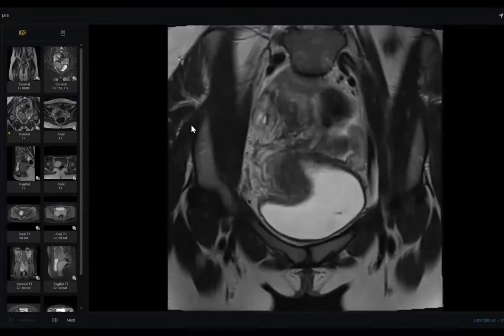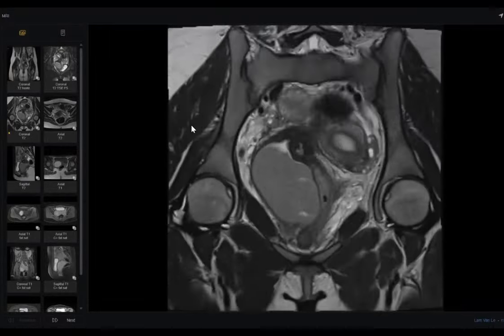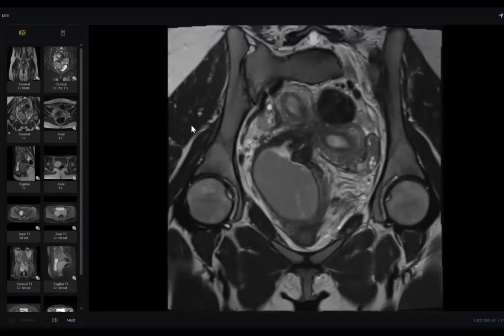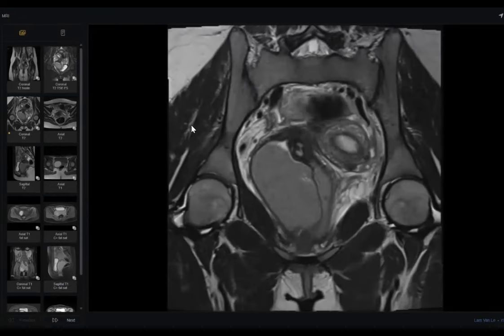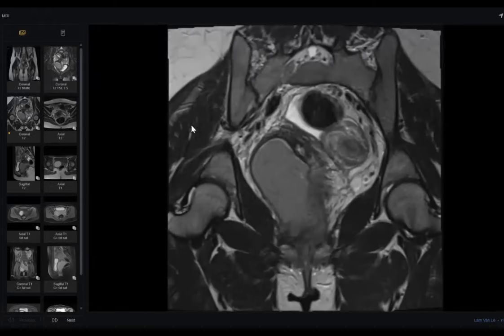So I can see that, as mentioned in the prior axial sections, there are two separate uterine cornua. There are two separate cervixes also visualized. Yeah. So, I can see the cervix. Your diagnosis? Yes, sir.